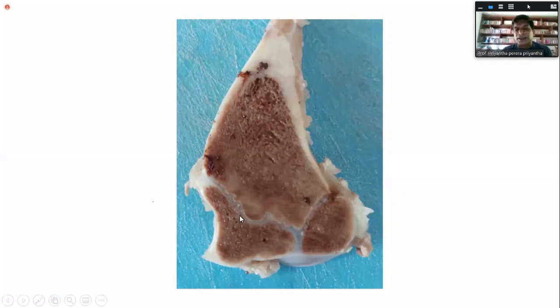Right. So what happens in rickets is that the growth plate starts producing osteoid material, osteoblastic action. They produce osteoid, but it is not mineralized. So you get accumulation of osteoid here without mineralization. The osteoclast can't resorb or remodel osteoid. It can only remodel formed bone.